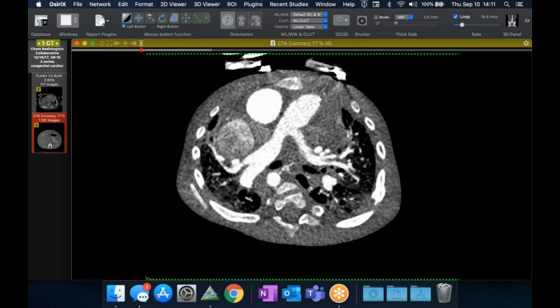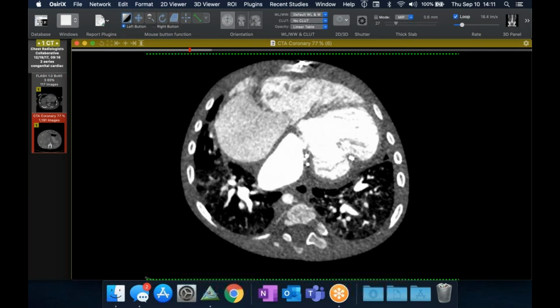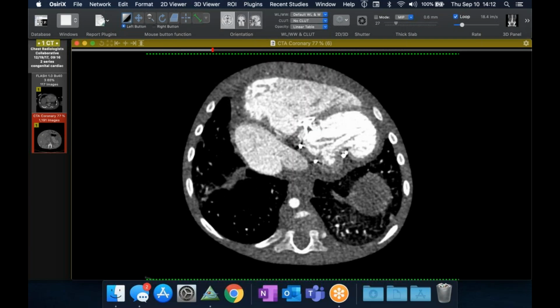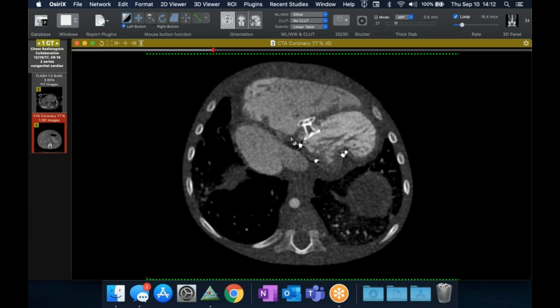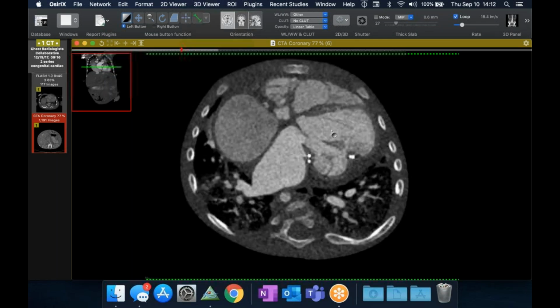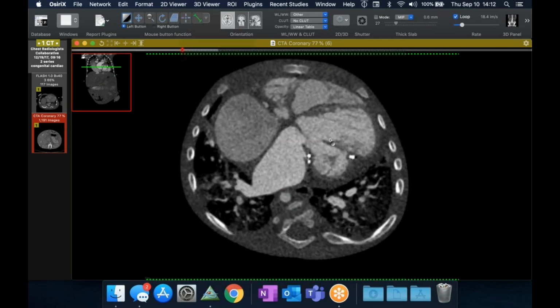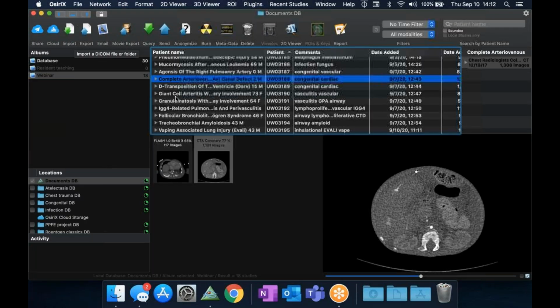Now it looks like this is post repair, I believe. Maybe not. Someone's been in there. Yeah, this is after they repaired it there. So you can see that closed the VSD, and I'm not sure what else they did here. And then you got the atria connected to the right place and the correct outflow. So, but yeah, so an AV canal defect.